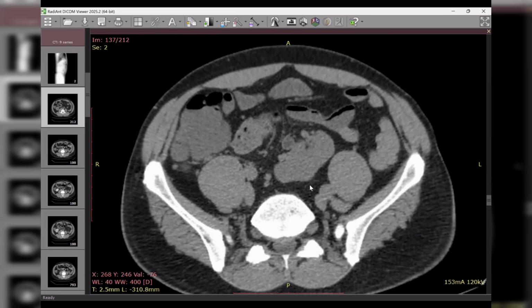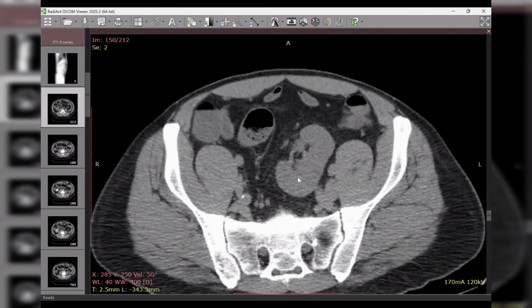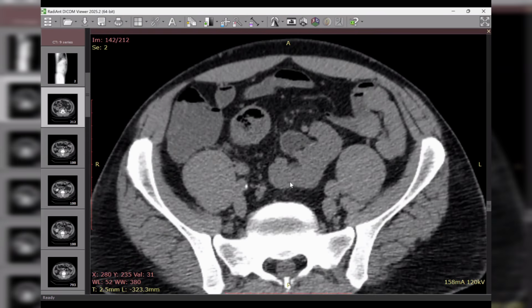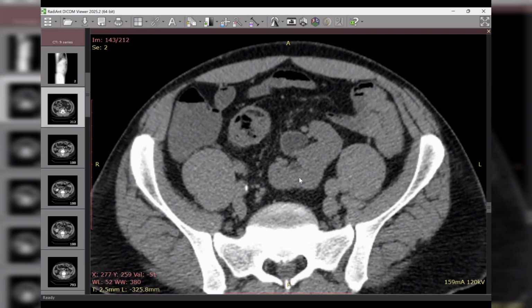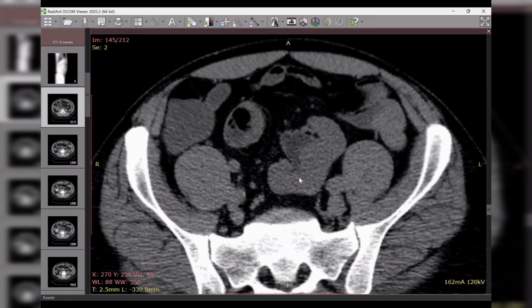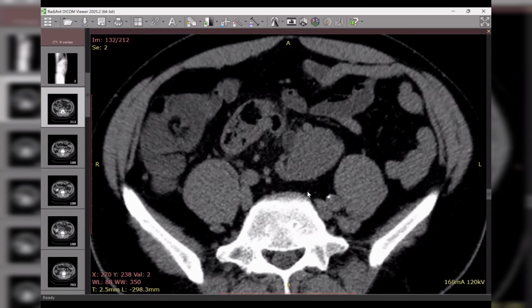There's also hydronephrosis which can be seen in the ectopic left kidney, and I think the inflamed part of the bowel is very closely contacting the left pelvic calyceal system.